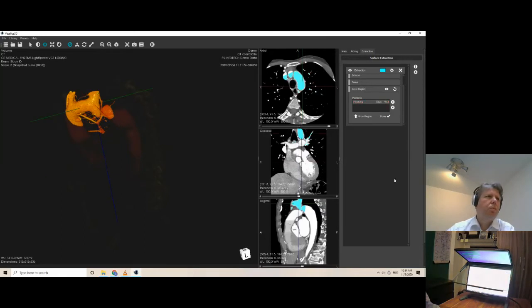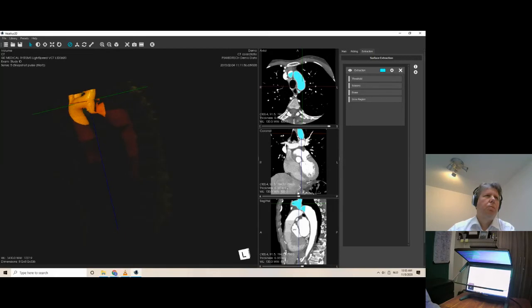I hit this because this is the region that I want to have. And I say, I'm done. Look at the screen over here. Bam! You see it? It's cleaning the model. It's cleaning the model. And it gives you the 3D print, basically, that you want to have. So I don't know how long I'm talking right now, but it's not very long.